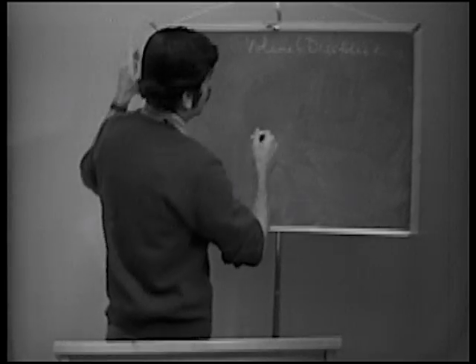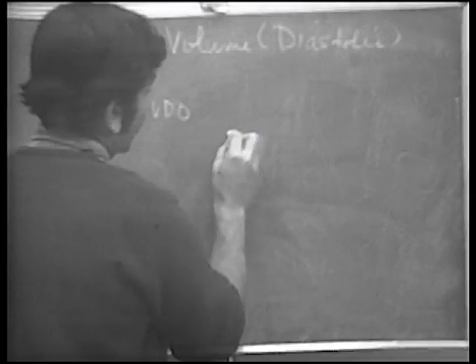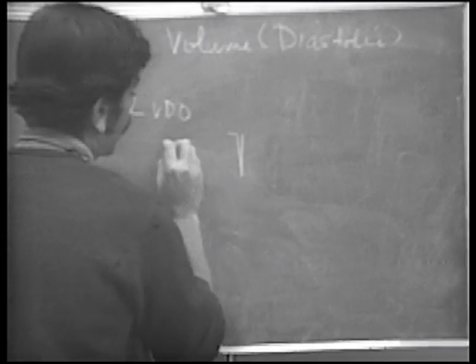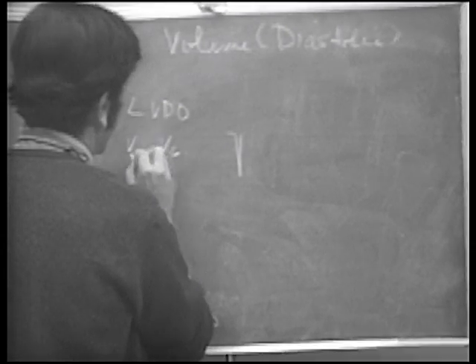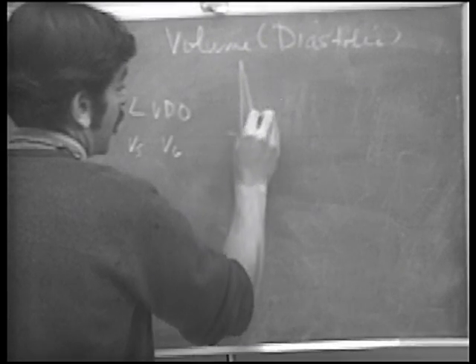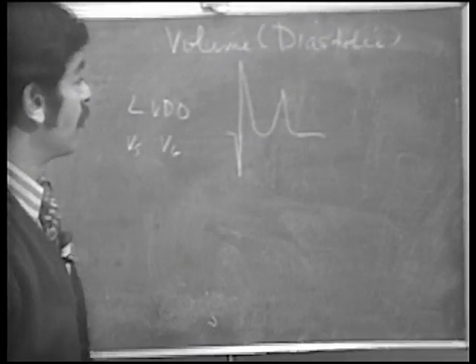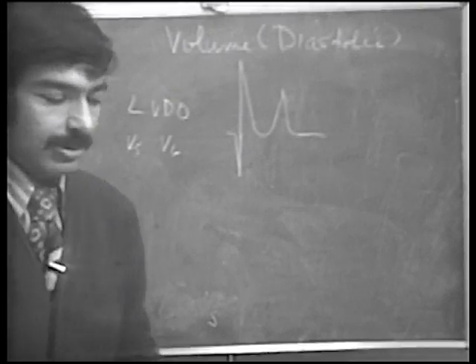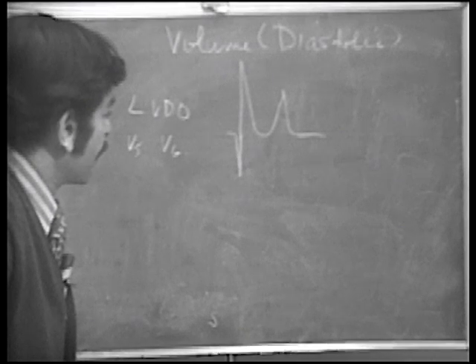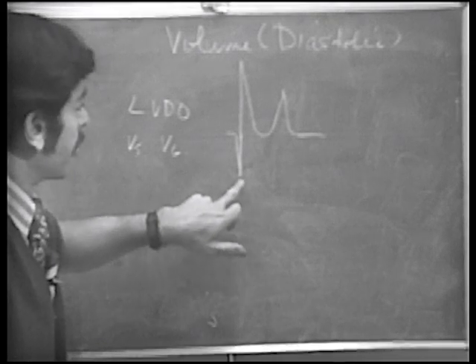And the typical changes that you might see in left ventricular diastolic overload, for example, are a prominence of the septal Q, let's say in lead V5 or V6, the lateral leads, the left ventricular leads, and you see some T wave peaking. You see a prominent septal Q and you see T wave peaking. Okay, so this might suggest then a volume overload of the left ventricle, somebody that has a patent ductus or some congenital problem.